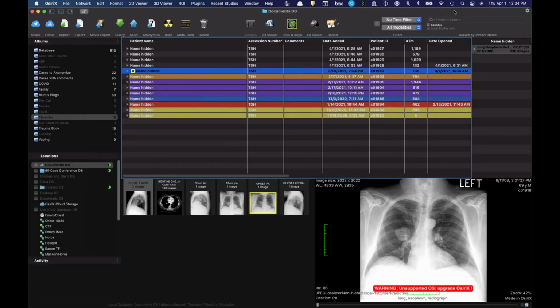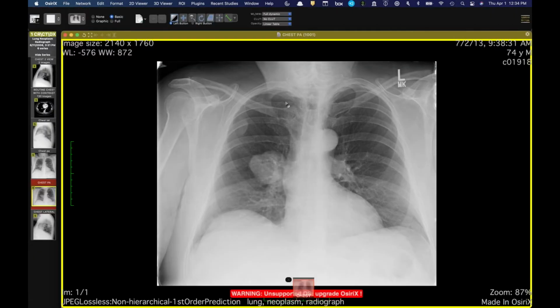All right, you see my database screen here? Okay, this is a quick one and just a fun radiograph. I was pulling this case up for a talk and happened to notice a finding that hadn't really been appreciated at first. But I think a couple things.